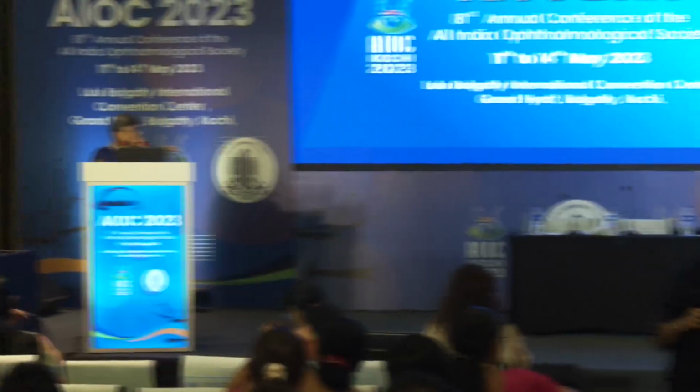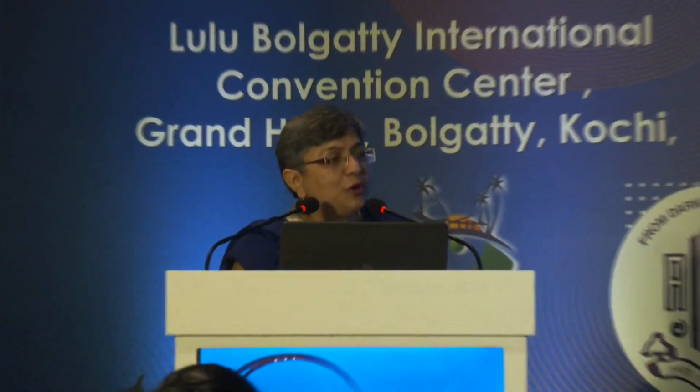Yes, I suppose. I think I was just trying to make the point that green doesn't mean normal. Usually it's the RNFL printout which is going around. Most people would not do a GCA or a GCC for routine glaucomas. So the idea was just giving, but yes, I suppose the GCC might have given us more clues if we had done that. Correct. Point taken.